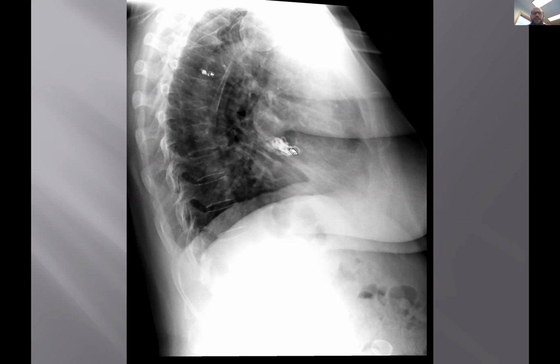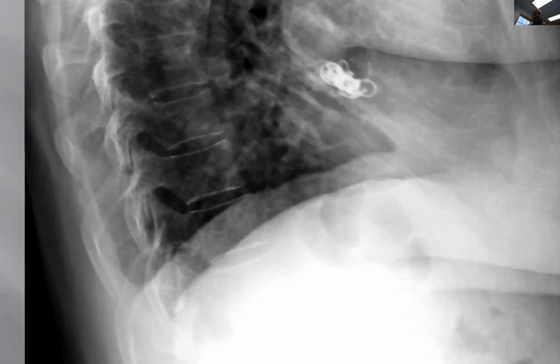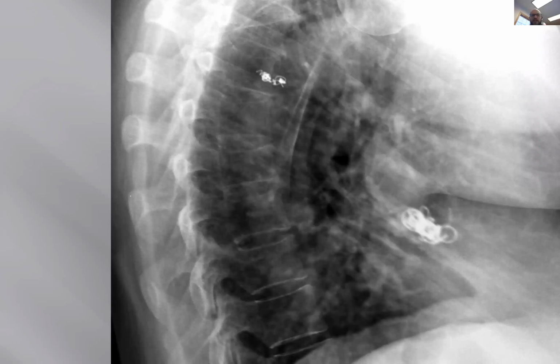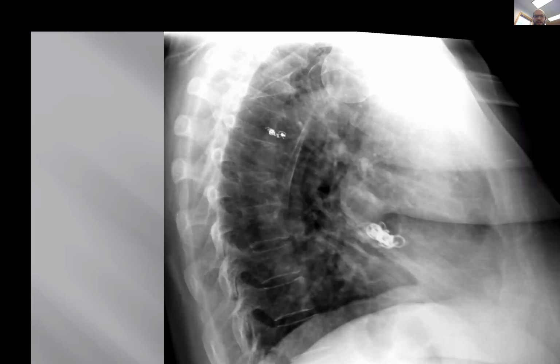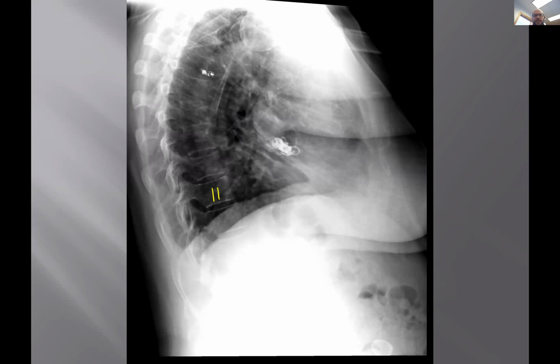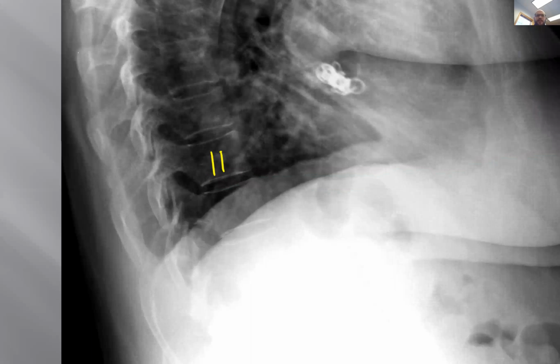But I want you to focus on in your detection to look at the technical factors, alignment. I want you to look at the bone, and I'm going to let you do that first. I'm going to kind of get this a little bit bigger, and I'll be real nice and blow this up a little bit for you. And look at the bone now, and I want you to compare. Let's say right here is T11. I'm going to put 11 there and then expand it again. So that's 11, and I'm going to go like that.